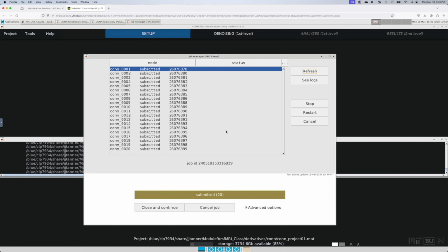So really what I wanted to say is, if I had given this more time before going and saying let's reprocess this, but I'm not really reprocessing anything, then the denoising step would have shown up. It was still doing some background processing, even though it said it was done. So just give it some extra minutes before moving on. But again, you can reprocess, or if you want to just check and make sure, oh yeah, did this really finish correctly, then you can do what I did and reprocess.